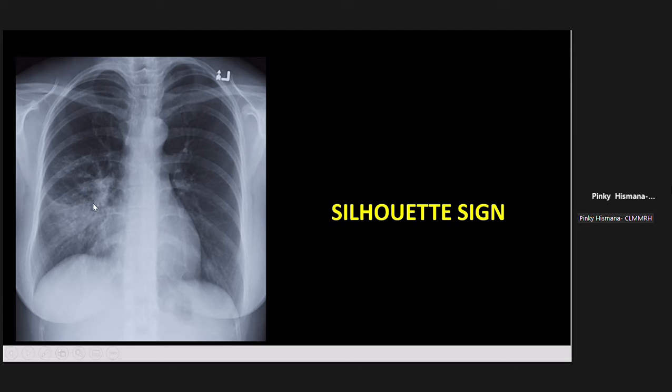In this case, pneumonia usually would present as an opacity. Why would a pneumonia present with an opacity? Wild guess. John Mark Mundia, can we have John Mark Mundia? Why do you think a pneumonia would present as an opacity? Why not lucency? Good evening, Doc. Wild guess, Doc, about the opacity: usually due to infiltrates, Doc.